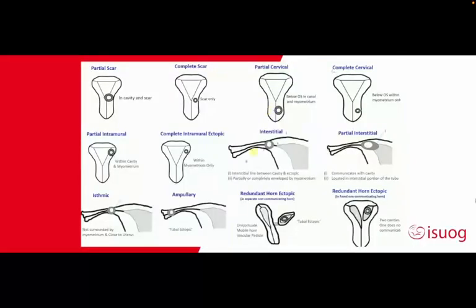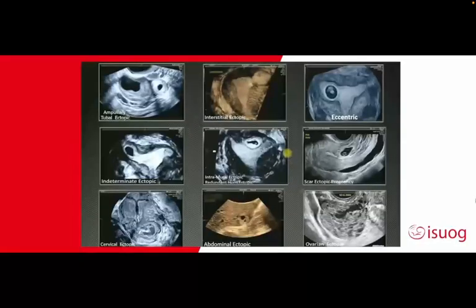If you look graphically at ectopic pregnancies, they can be divided into this group of 9, and I will go through these one by one. I find that the graphics of the location of both the intrauterine pregnancies, lateral ectopic, and other ectopic pregnancies is very helpful when you compare my description to the sonographic findings. I'll start with the most common, the ampullary ectopic pregnancy.